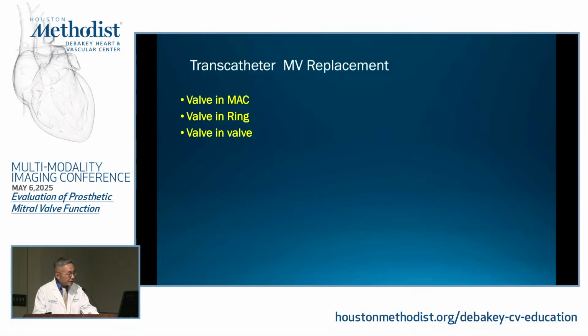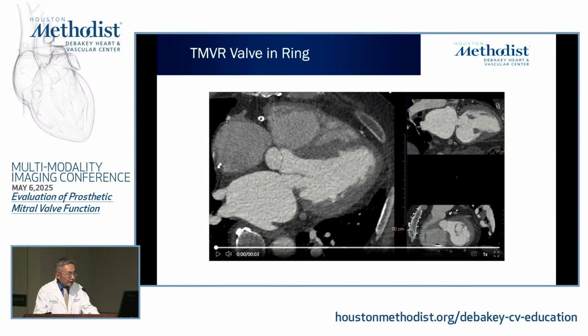Briefly, with transcatheter mitral valve replacement, you heard multiple times of valve in MAC, valve in ring, valve in valve. So all this refers to patients who have some prior procedure done, like for instance, a ring that we saw earlier, surgical prosthetic valve, or severe MAC. So the valve we put in here, usually the one that's been approved, is a SAPIEN valve, okay?